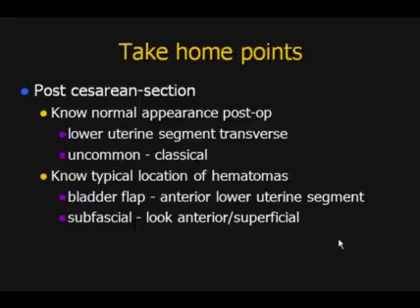Remember the post-cesarean section patient, know the normal appearance. Beware of the appearance in the less common cases of the classical or vertical incision in the uterus. Hematomas in these patients is the most common in the bladder flap area, that is the anterior lower uterine segment, but also remember subfascial hematomas.